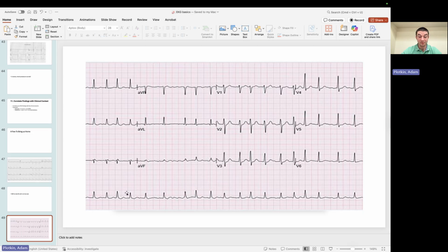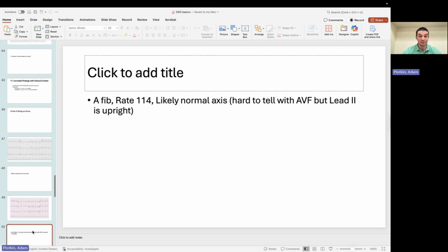Okay, so this is definitely AFib, right? Irregular. I'm not seeing any discernible P waves. And in between, I get these nice fibrillation waves. This is AFib. Remember, AFib usually occurs from an ectopic foci at the pulmonary veins that just kicks off, and we shoot through. So really, I want you to understand the pathophysiology of it coming from the pulmonary veins.